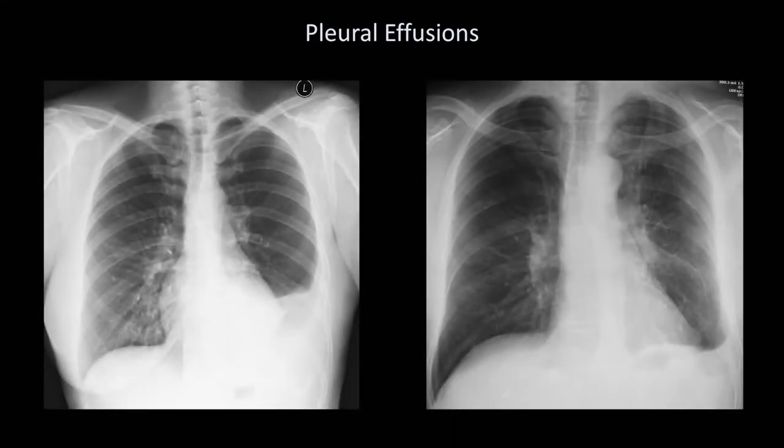So here are two examples of left pleural effusions. The effusion in the X-ray on the left of the screen is noticeable only from its blunting of the costophrenic angle. Because of capillary action of the fluid, the effusion often tracks slightly upwards along the pleural surface.